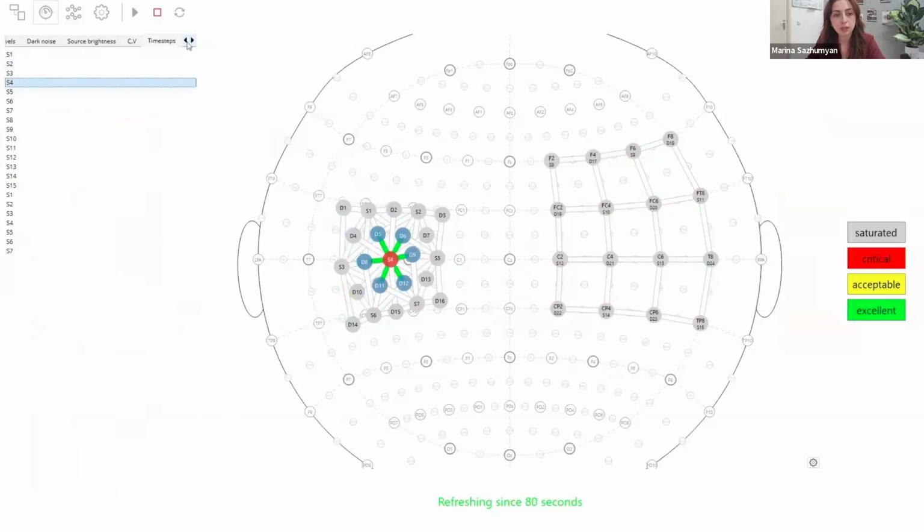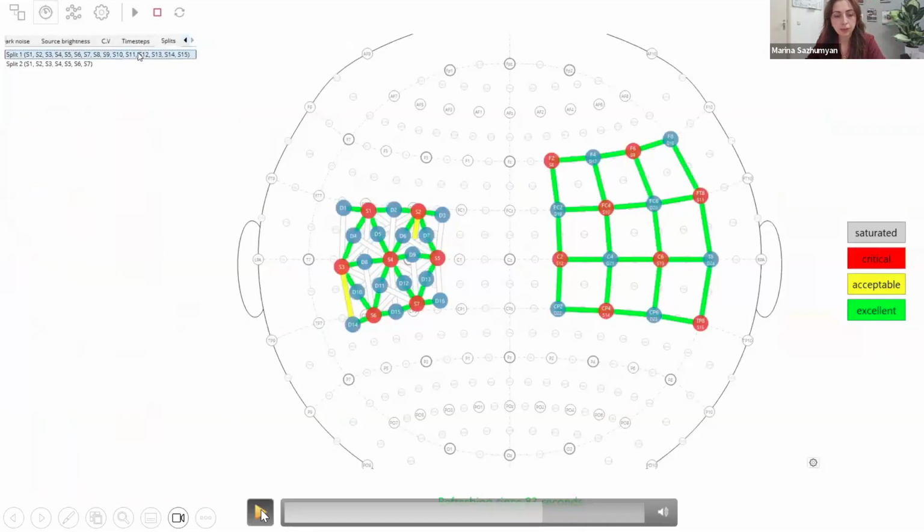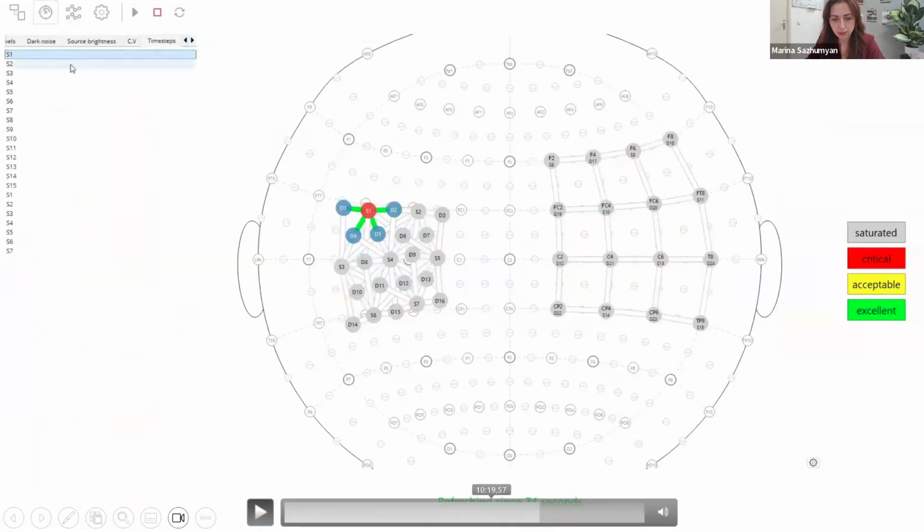So here in the time steps icon, I will pray that if I go back, it's not going to, okay. Yeah, here we have the different time steps. And you see where we have our split, we did set our split ratio to split those 7 sources. So the split group is adding those time steps. We have now plus 7 time steps in our recording cycle, right?